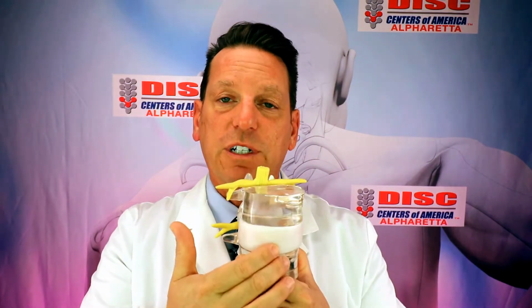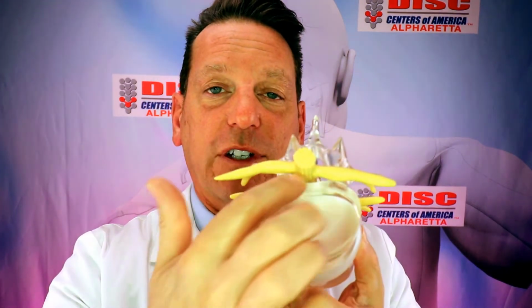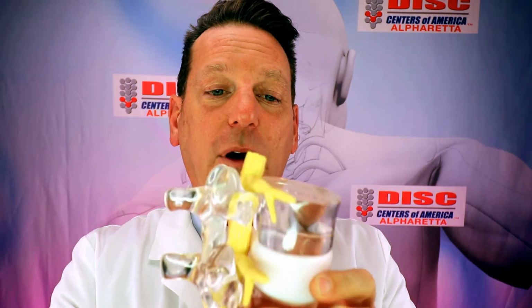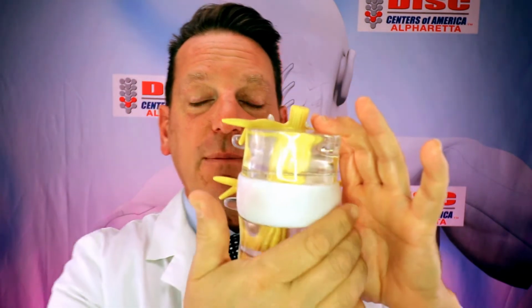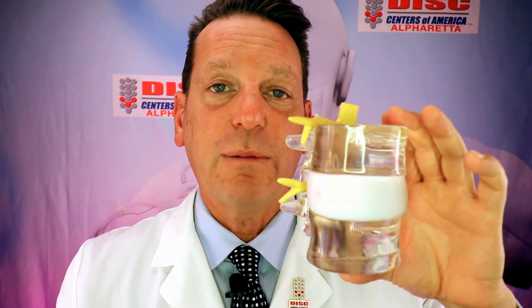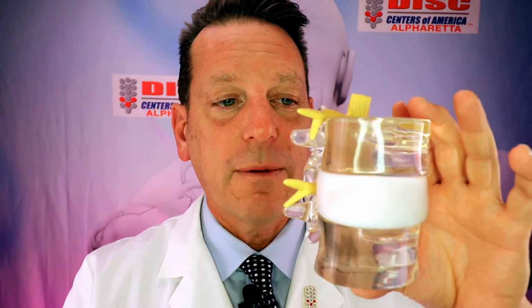Okay, so the human spine is made up of 24 different bones, and there's a few parts to the bones when you look at them. If you look at the front part right here, this is called the vertebral body. It's the big part that bears a tremendous amount of weight for us. You have the thing in between that's called the intervertebral disc. So if you've heard of someone herniating a disc or bulging a disc or slipping a disc, that's the structure they're talking about right there. I'll show you some more detailed ones in a minute.